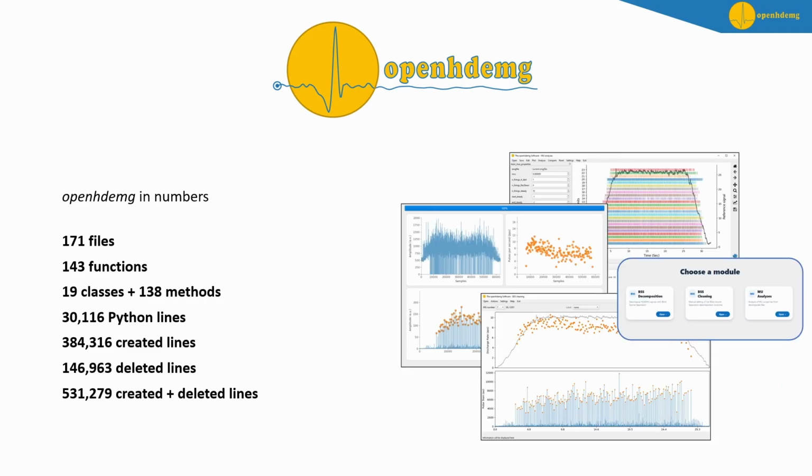And on top of this, as if it was not enough, we now also have a software. So instead of using the library to write your functions and your code in a simple way, you can also download the software and just click a number of buttons and get all the results that you will need. In today's presentation, we start with the software, because we will have a quick look at the decomposition and cleaning. The decomposition can easily be done also from the code, but when it comes to the cleaning, we need a graphical interface, because we need to inspect the motor units, add and delete firings, and interact with the signal.